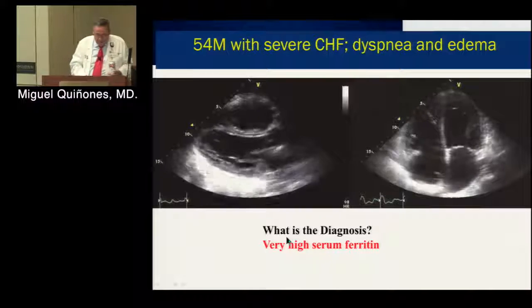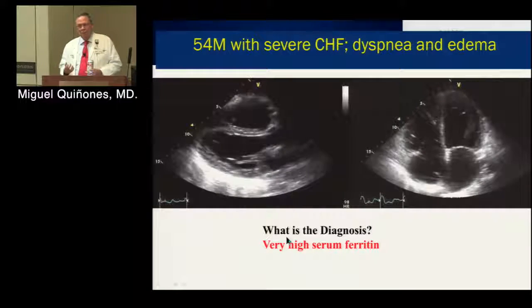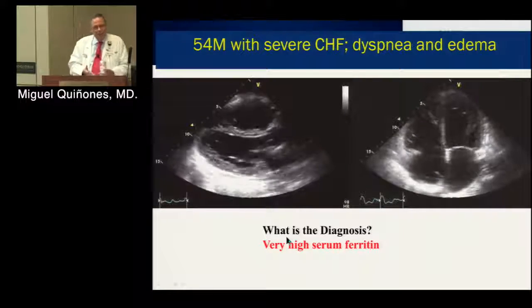Okay? Yeah. Again, this is the very end stage. By then, you may pull as much iron as you want. It's unlikely this guy's going to get better. You would like to pick them up a little earlier than that.